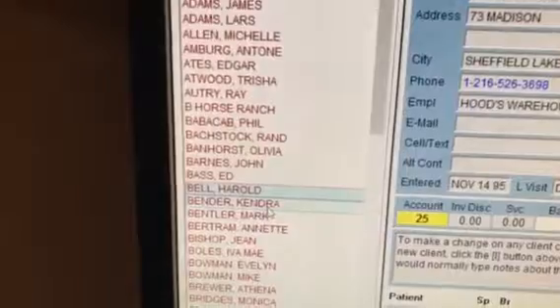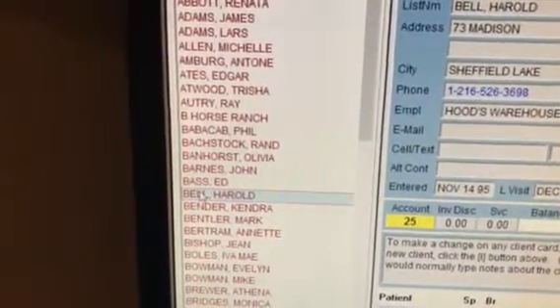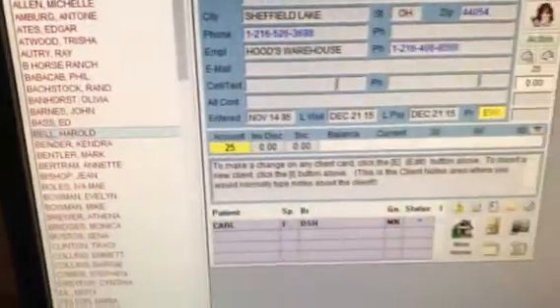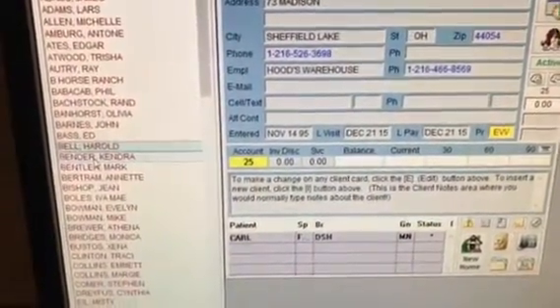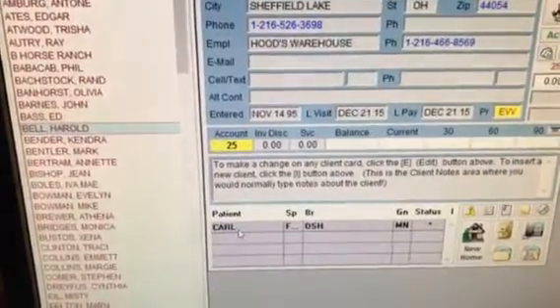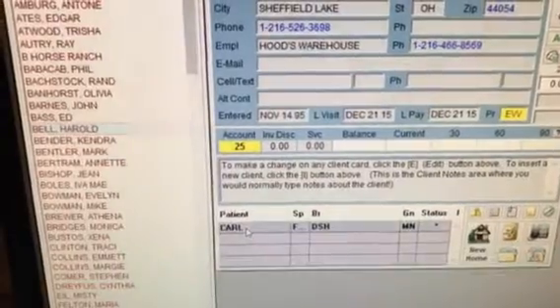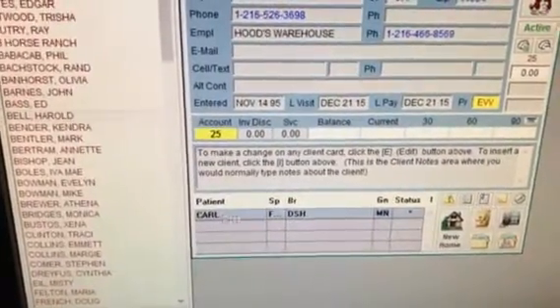To get started, I'm going to go to my client list, and in this case I'm going to choose Harold Bell. That will bring up Harold Bell's client card. In this case, Harold Bell has a domestic short hair named Carl. I'm going to highlight Carl by clicking in the patient field.